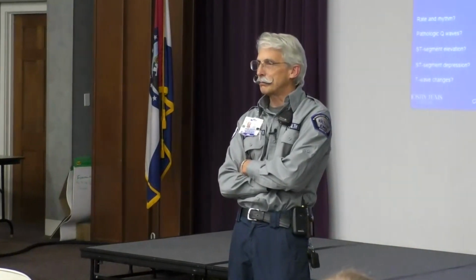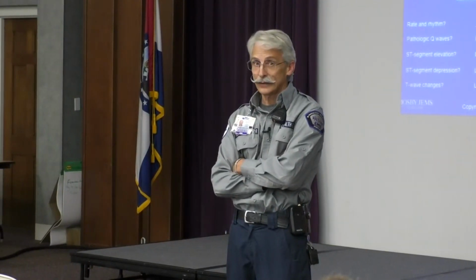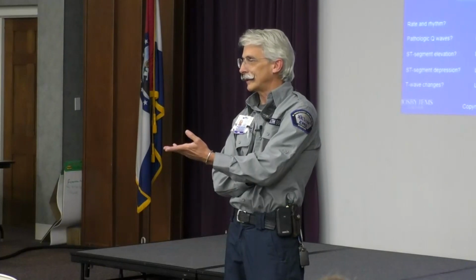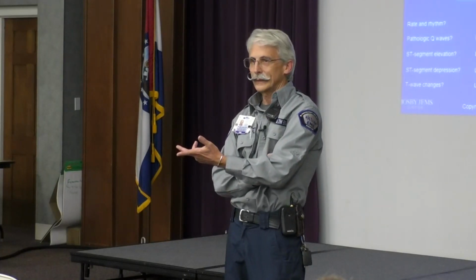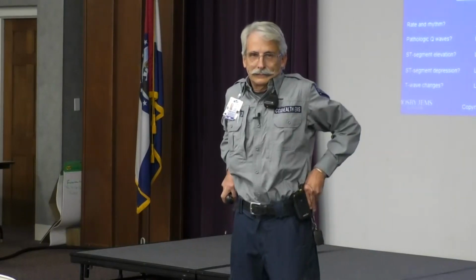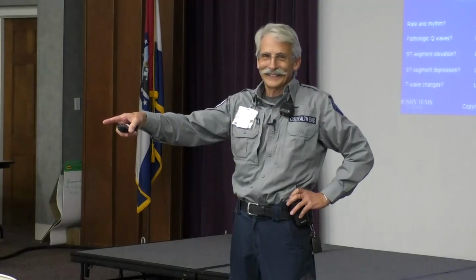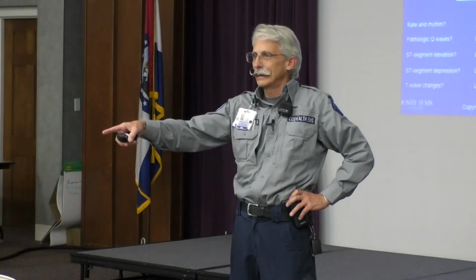If it goes above 4 millimeters, to 5, it now meets the Sgarbossa criteria to say this is still an MI. There's three Sgarbossa criteria, and there's more.